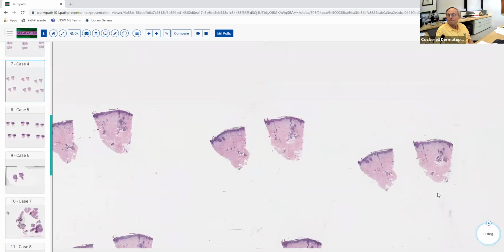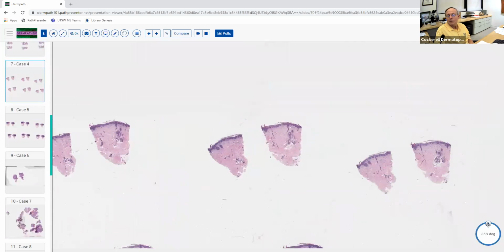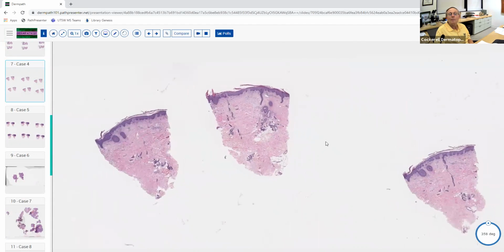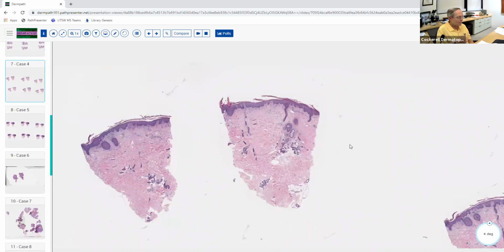Okay. This was a little bit more challenging. So we don't have something that's just kind of screaming right off the page at us the same way that the last one did, but that diagnosis is still available to be made here.